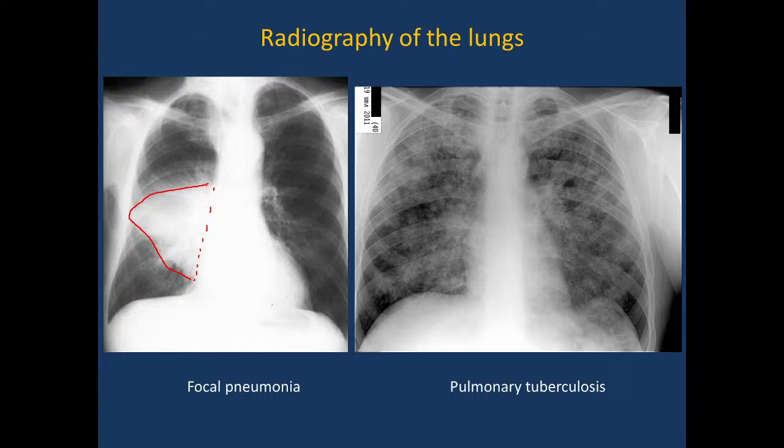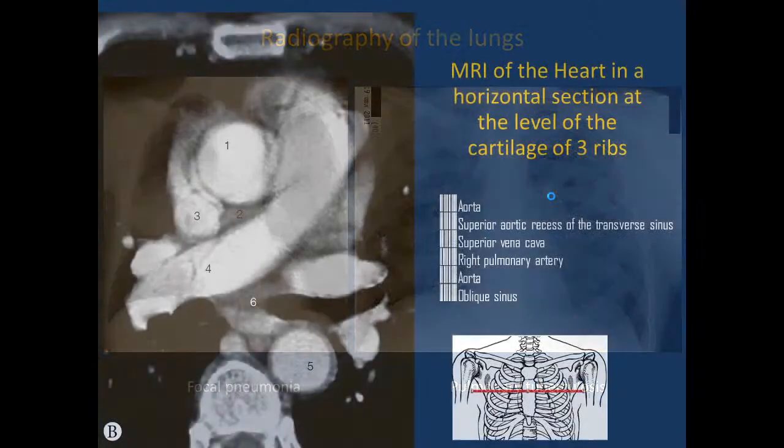And when we examine patients who have COVID, we often see pneumonia areas around all of the bronchi. Here is another disease, pulmonary tuberculosis. These are spots, small round spots in all of the lung, in right and left lungs. It is a very hard situation. It is not good for the patient.